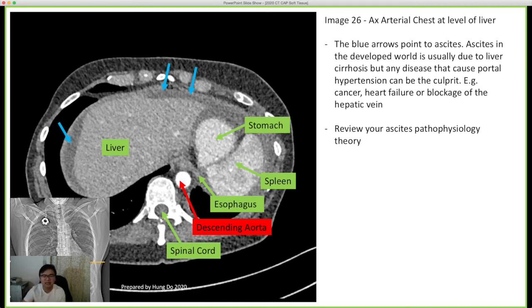So you can clearly see here that this spleen isn't as uniform as the stomach. It has this black splotch and this black splotch and this white splotch here. That is very, very normal on the arterial phase.